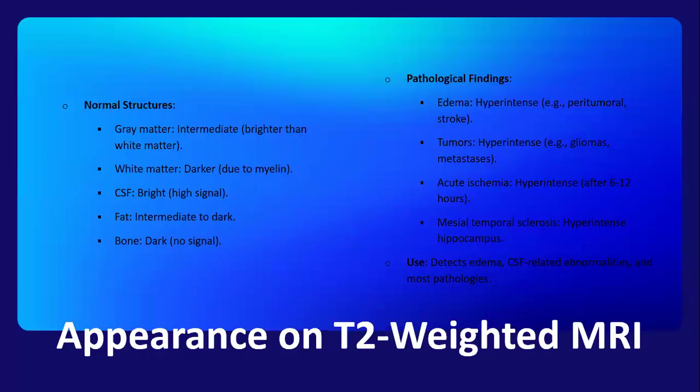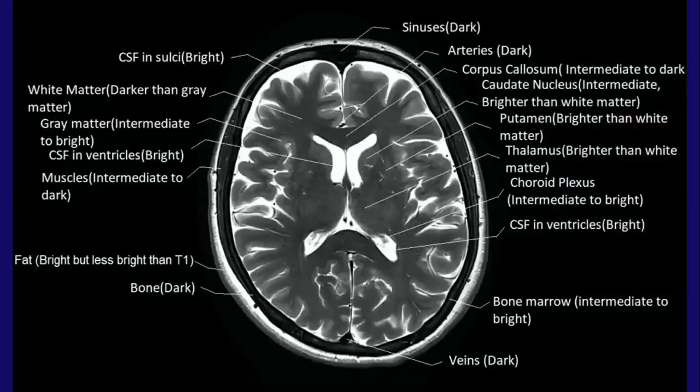So the moral of the story here is that I want you guys to be able to see what particular MRI sequence you're looking at, whether it's a T1 sequence or a T2 sequence. Then, based on what we have discussed in terms of the different properties, where the fluid is or what it has compared to fat, you'll be able to try to make some kind of a diagnosis. Next slide, please.